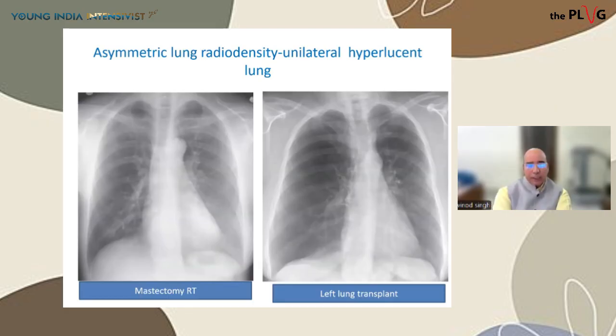Now, if you look at this, some of the soft tissue lesions and some of the changes in the translucency: if the lung is unilaterally hypertranslucent or hyperlucent, what are the differential diagnoses? The differential diagnosis can be soft tissue, can be lung, can be thoracic cage also.